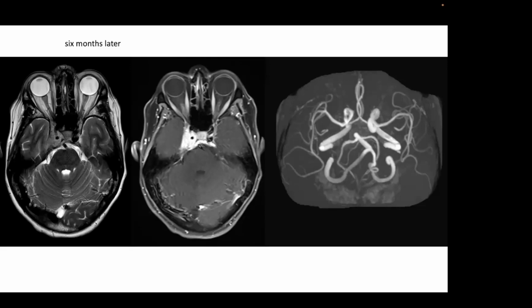On the right side? Yes. What do you think that is? Isn't it the venous sinus? Okay, that is a reasonable thought. It could be an enlarged sinus, but we know the patient is symptomatic, so we're probably thinking there's something pathologic here.